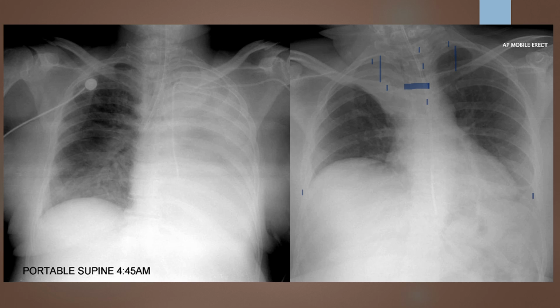Next, we're going to look at their mid-sagittal rotation, which we already technically evaluated when we looked at that midcoronal rotation. So now we're going to look at our mid-sagittal tilting. Here you see that the patient is very tilted. You can tell that their head is turned towards their right, probably affecting some of that body tilt. So when I go to repeat this exam, I'm going to have my patient put their chin up and face straight up if at all possible. If I look at the scapula here, I can see that the patient's scapula does superimpose the lung field. So we need to make sure that we're rolling that patient's shoulders forward on our repeat image.